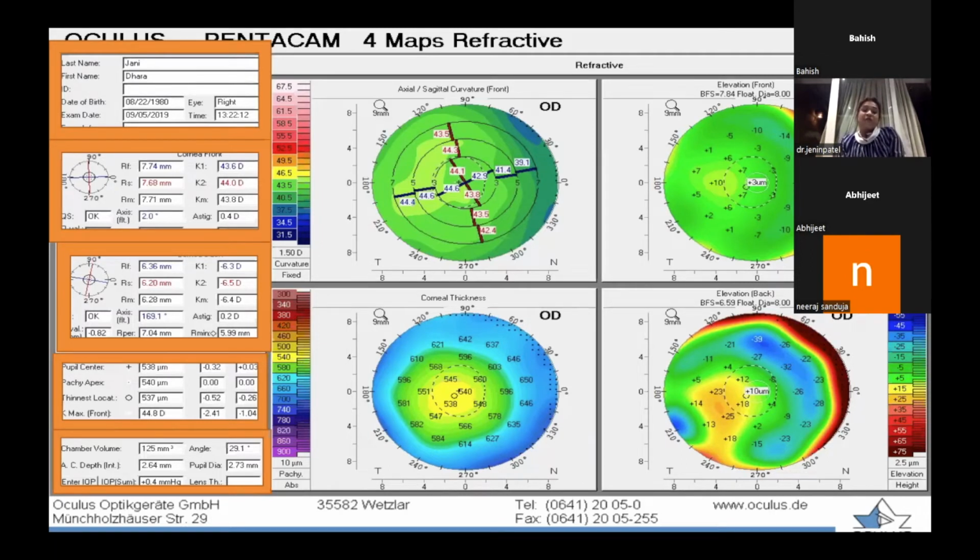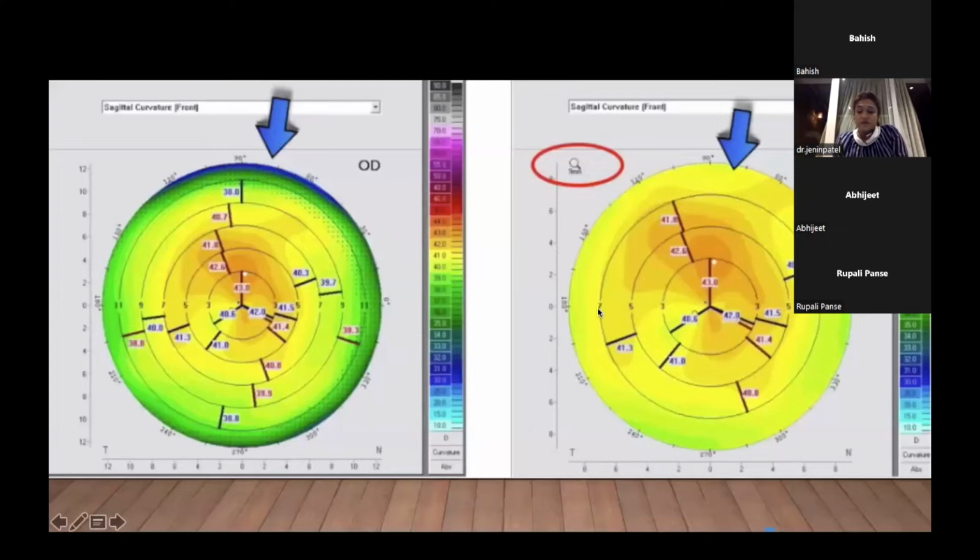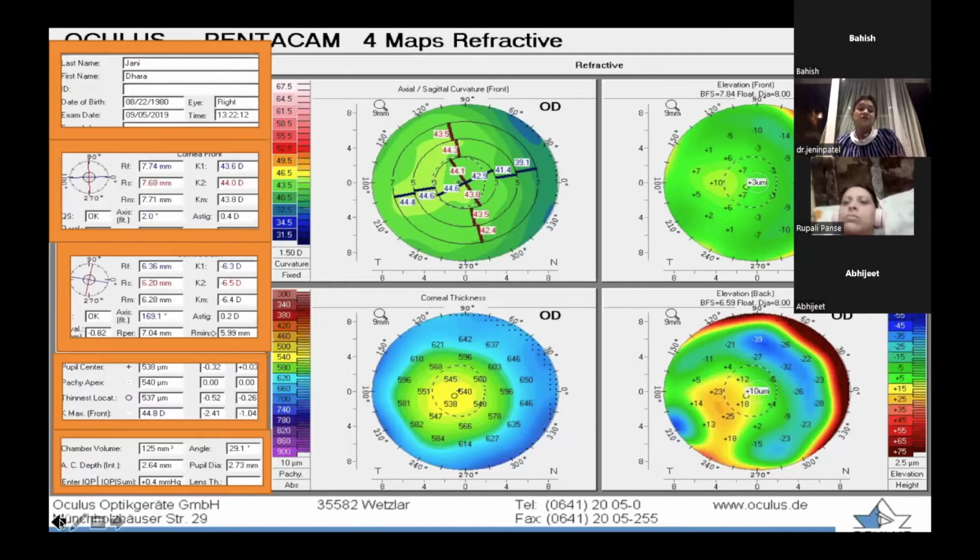Okay. So when we are looking at the anterior chamber, I have a couple of examples in the Pentacam itself where we could discuss the plus and the minuses again. Then we have the anterior chamber depth, and in the Pentacam, you have to adjust whether it is external or internal. In this particular case, it is internal. For all your toric ICLs and your basic ICLs, the cutoff value for the internal anterior chamber depth is 2.8.